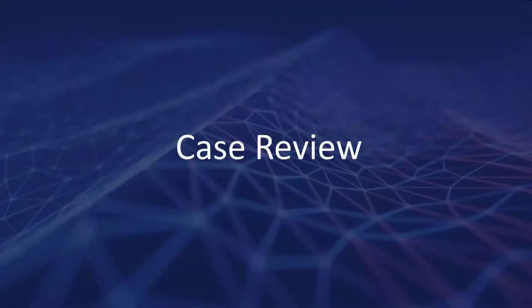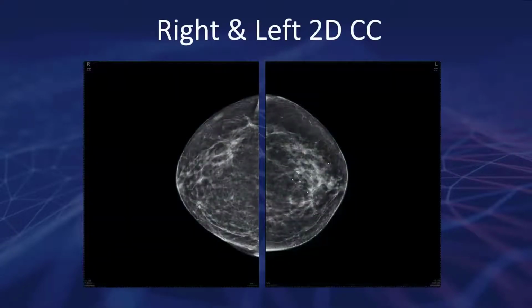This case review was given to me by a colleague of mine. It was a 75-year-old patient. If we go ahead to the next slide, I'll show you the CC projections, and this is in 2D, 2 dimensions.